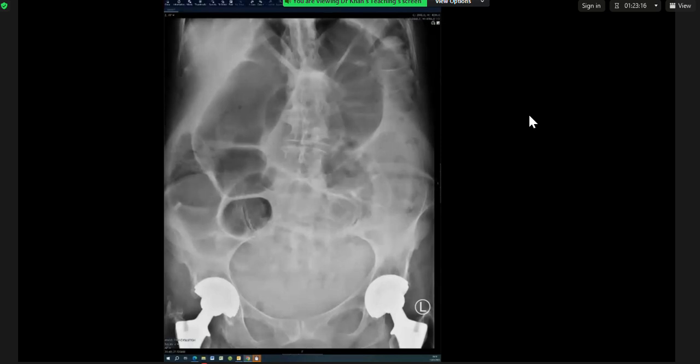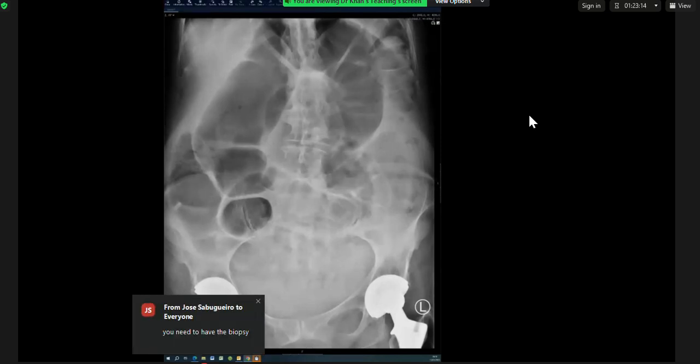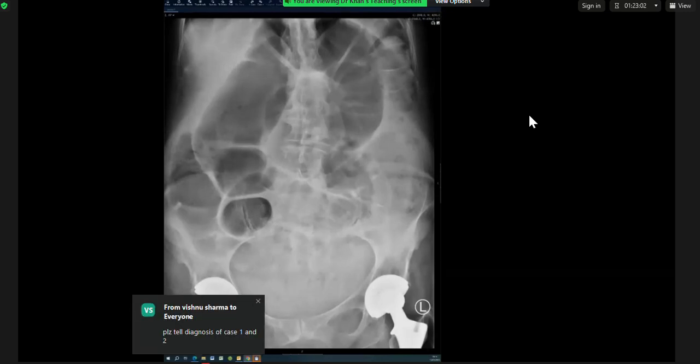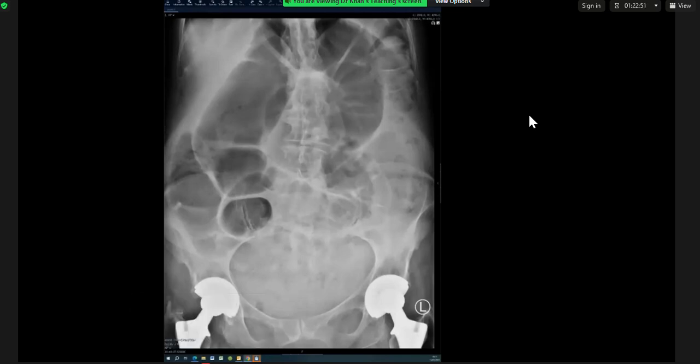However, I cannot detect any gas within the rectum. I cannot detect free air in the abdomen. I cannot detect any hernia or feces. However, on the left side, there may be a bit of translucency here. I would like to scan the rest of the view.